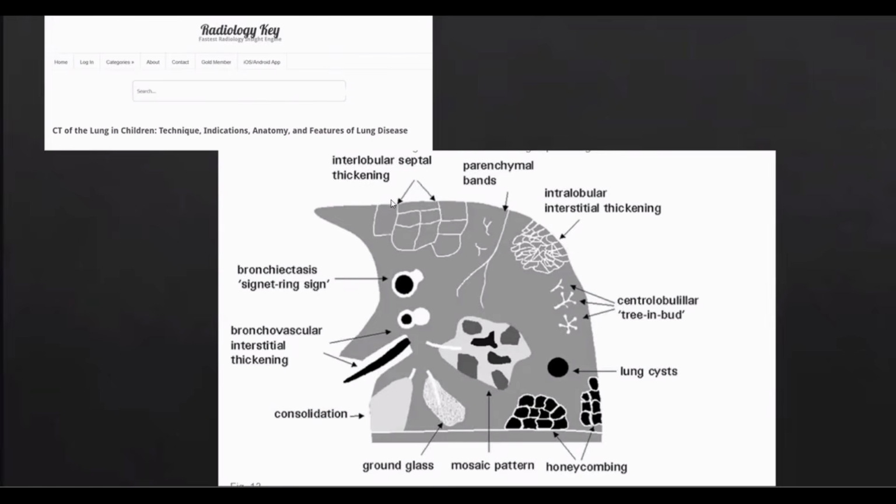We have either the interlobular septal pattern, as we saw in cases of lymphangitis carcinomatosis. Bronchiectatic changes, we saw this one besides cystic lung changes in one of our previous sessions. Today, we focused on the intralobular interstitial thickening or reticular shadows.